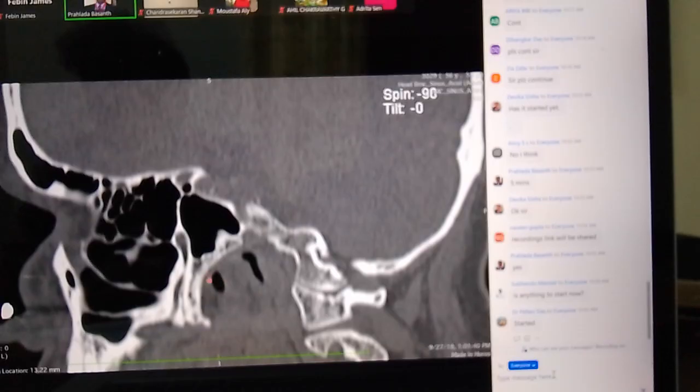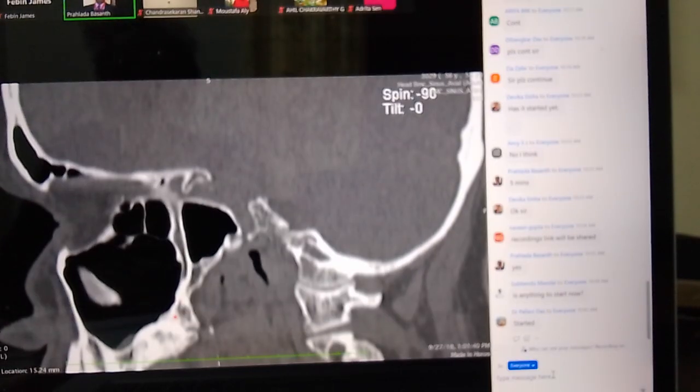This is the opposite eustachian tube, and this is the left side, the sphenopalatine foramen, and the palatine canals, through which the greater and lesser palatine nerves pass. So opposite the pterygopalatine fossa, palatine canals, and the pterygoid pneumatization, fossa of Rosenmuller, eustachian tube, and the opposite maxillary sinus, orbital cavities, and the frontal sinus.